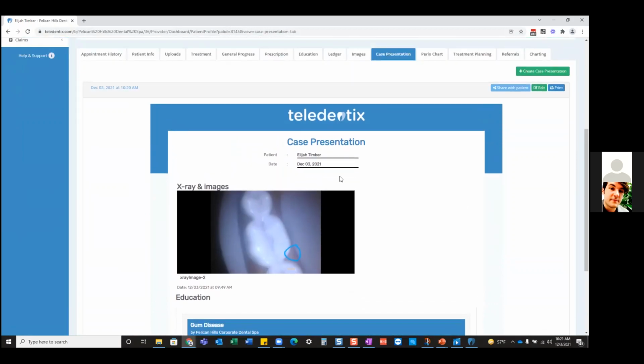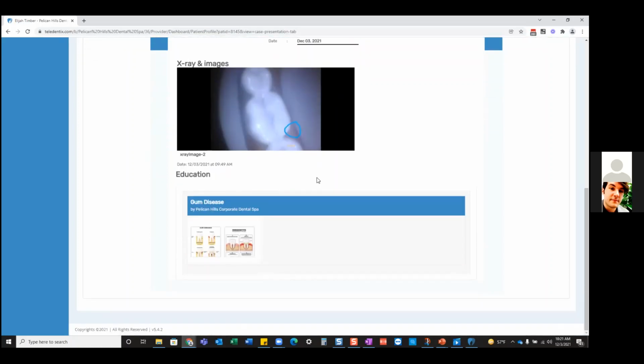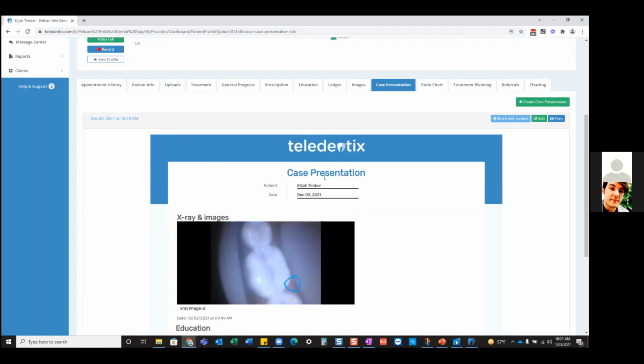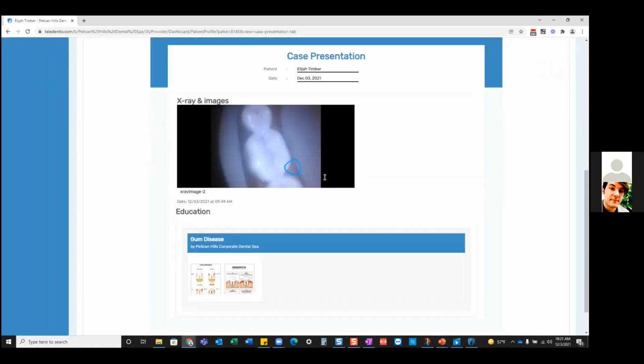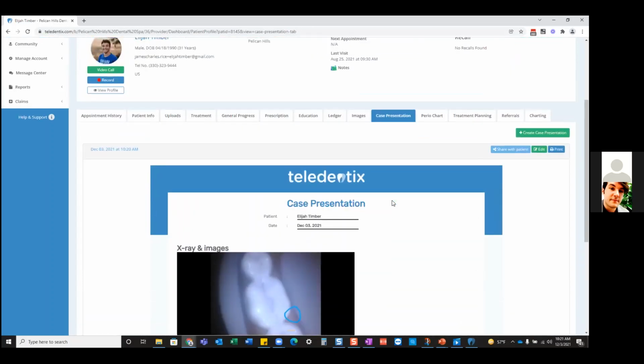So this is exactly what the patient will see when they log into their patient portal and they click on that case presentation that you shared. And this is exactly what the provider will see when you refer this patient and you attach this case presentation. So a case presentation can be as long and elaborate as you'd like, and as short and sweet if you make it that way by just selecting a few pieces of information.